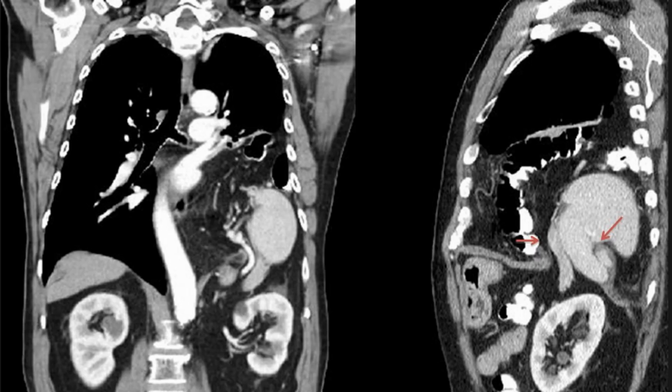All right, so what are we looking at here? Have you guys hopefully oriented yourself to what we're looking at overall? We're looking at the front picture here, and here we see the trachea moving down. We see it go to the right upper, lower, middle, and here's the left.